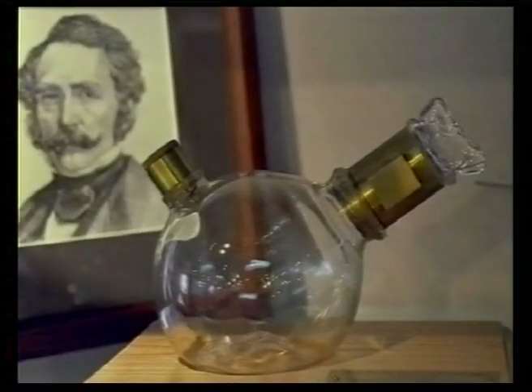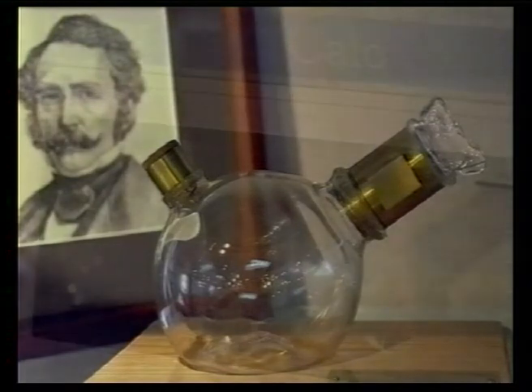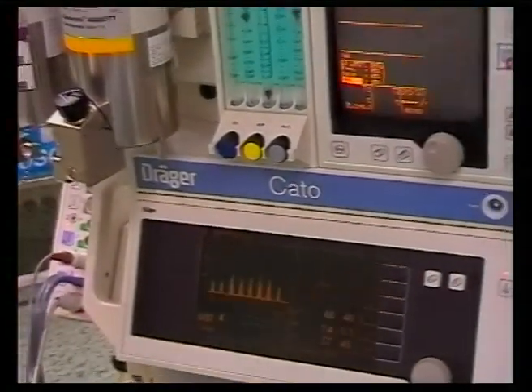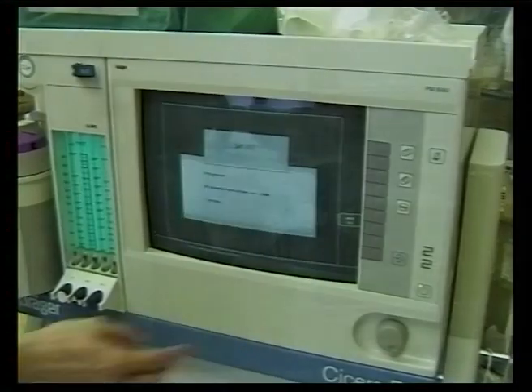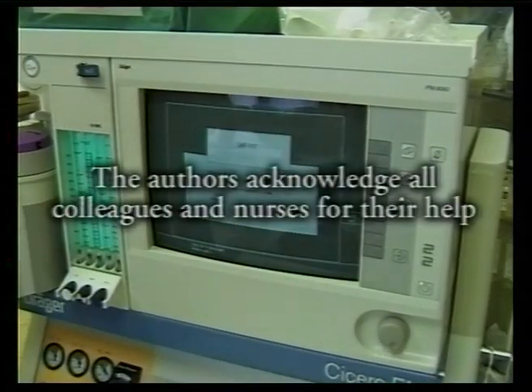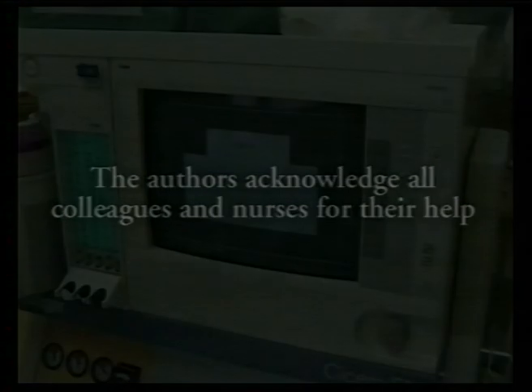The devices used for administering inhalation anesthesia passed a long way from simple aids to sophisticated electronic machines. However, the safety of any anesthesia is determined not only by modern equipment, but has always been and will be primarily a matter of education, skills, and vigilance of anesthesiologists.